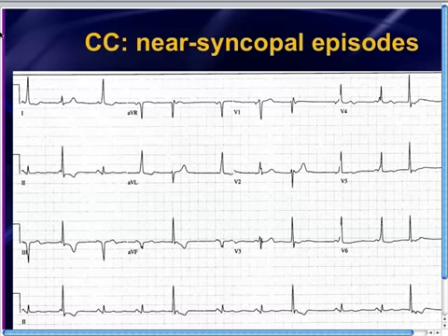You notice that there's a repeating pattern here. There's what appears to be a fairly normal beat, then a different beat, then normal, different, and so on. And this pattern appears to be continuing. You also notice, and hopefully this has popped into your head if you've been paying attention to the past couple of weeks of these cases, that there is regular irregularity. In other words, there's a normal beat, and then an early beat. Normal, early. And that pattern is very typical.